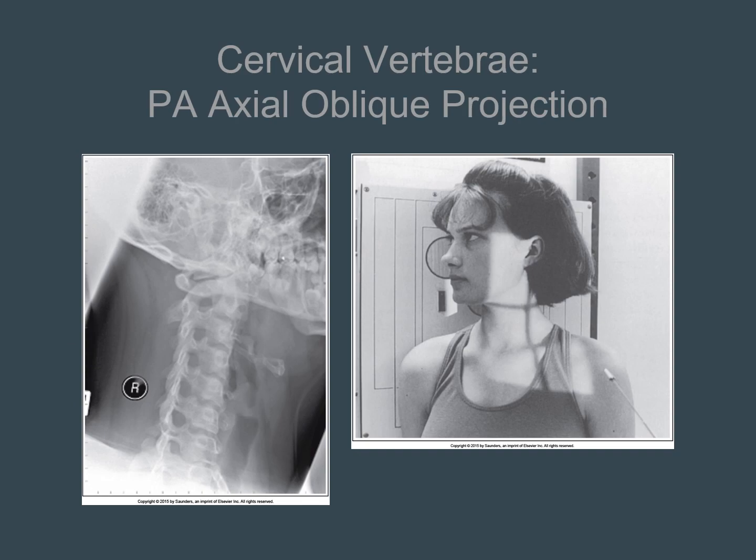Radiographic image analysis guidelines state that the second through the seventh intervertebral foramina should be demonstrated as open, uniform in size and shape. In the LPO and RAO position, the structures best shown are the right pedicles in profile, and the left pedicles are aligned with the anterior vertebral bodies.